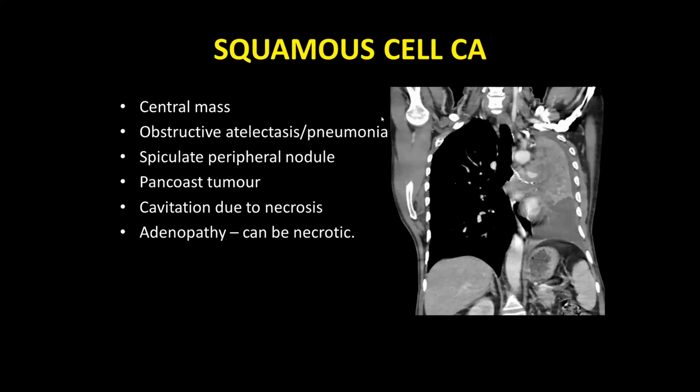So that was about adenocarcinoma and the biomarkers. So quickly, a word about the other tumor types we can go through. So there is squamous cell carcinoma, you all know. It's a central mass. Here you can see it's filling the entire bronchus, causing the entire lobar consolidation and then collapse, and then there is effusion also. The Pancoast is the pleural invasion in the apex.